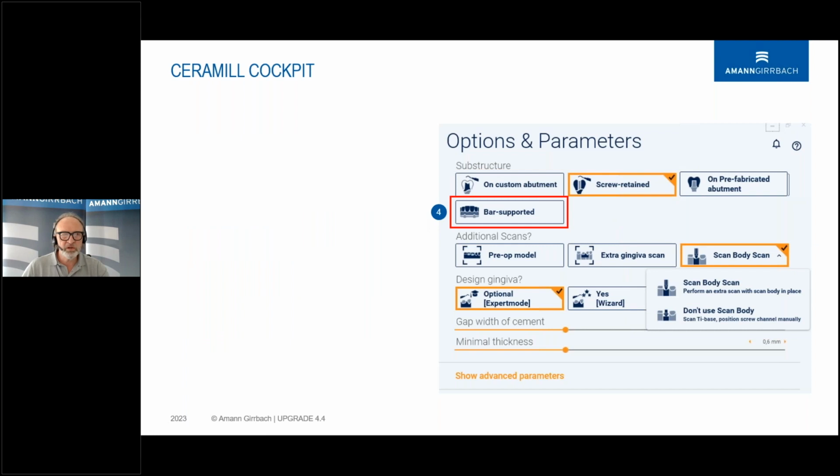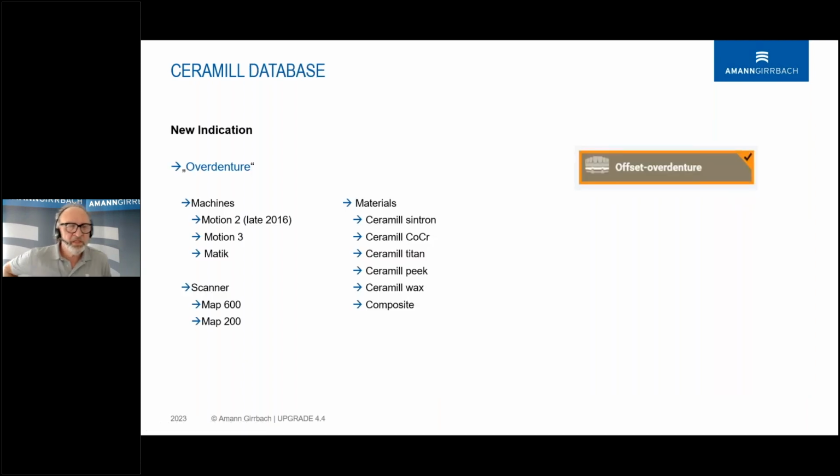Bar supported means a construction on a bar. Later on, some more details. So this is more or less what happens in the options and parameters section. So not too much, but in detail, you will have a lot of fun, and it's really cool.